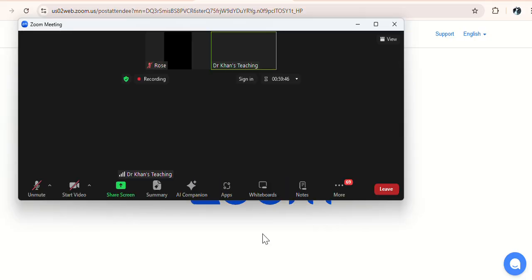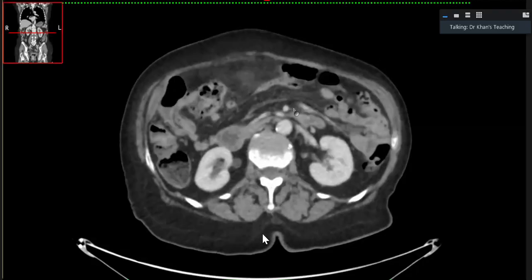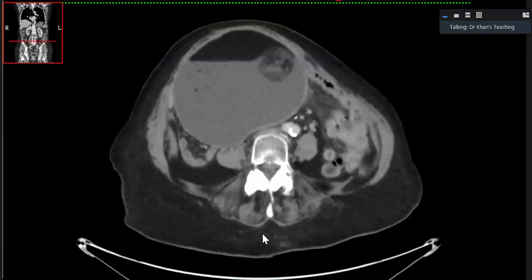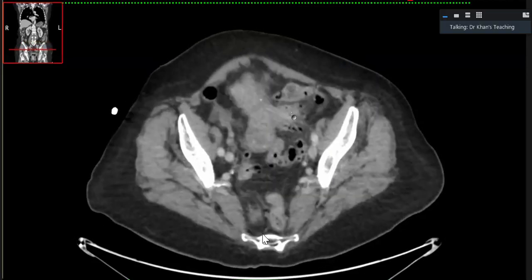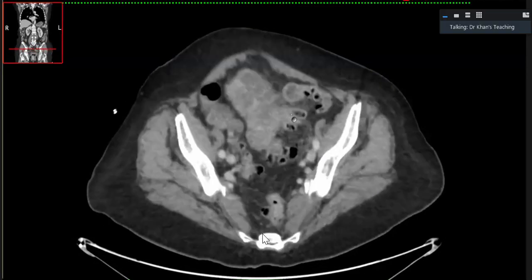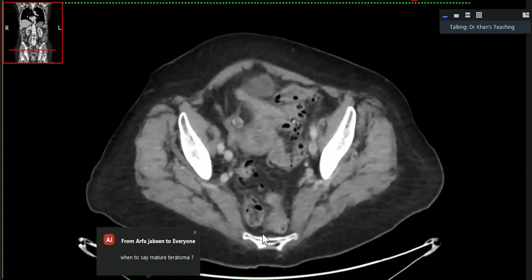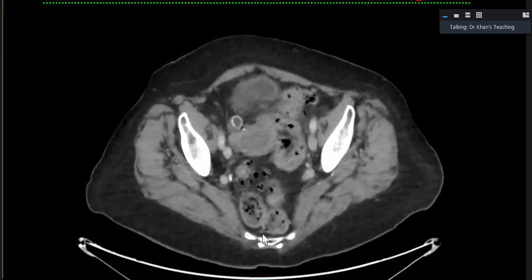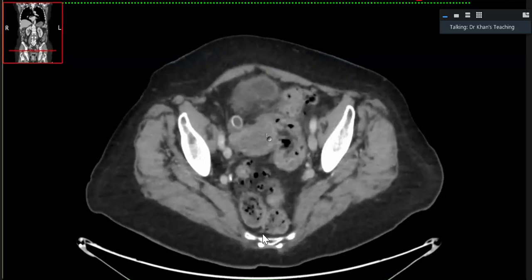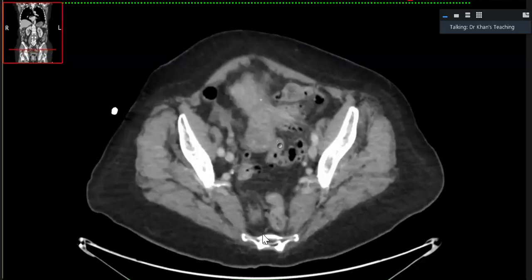So what happens is that I will show you a CT scan, because you can get this thing on a CT scan also. In immature teratomas, usually there is rupture and this goes into the peritoneum. So always look for that. In this particular case, there is some calcification here, but this was not fatty inside it, but might be a slightly chronic type of deposit sitting there.